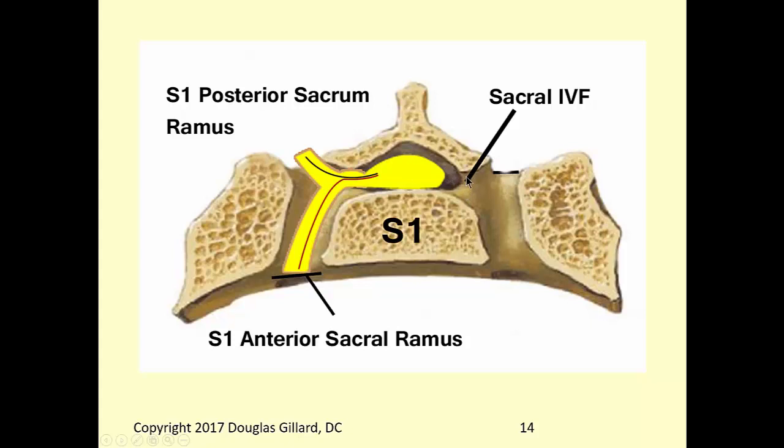There's the sacral S1 sacral intervertebral foramen, and it dumps into these anterior and posterior sacral foramen. So when the nerve comes down and splits into its dorsal and ventral rami, they're actually still inside the substance of the sacrum. That's some weird anatomy. That's not true for L5, right? When it comes out of the IVF, it splits into dorsal and ventral rami. They're flapping in the wind. They don't have bony protection like that does.